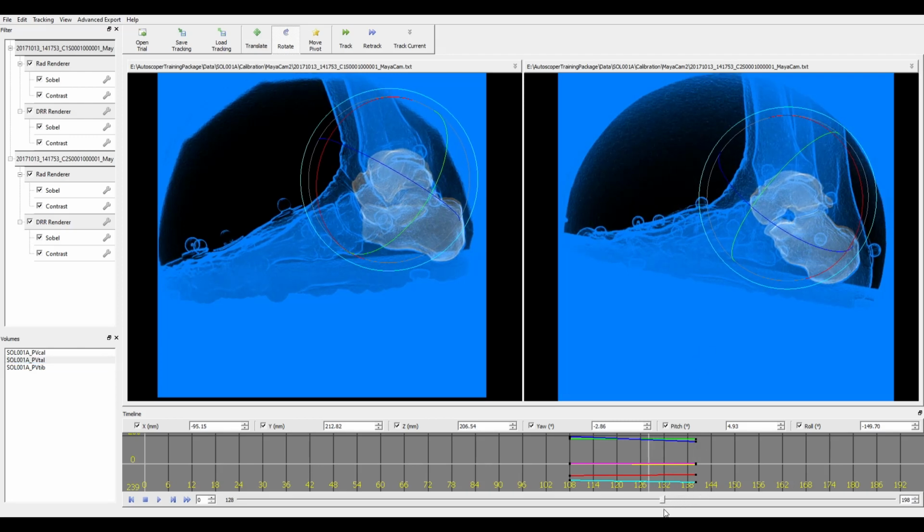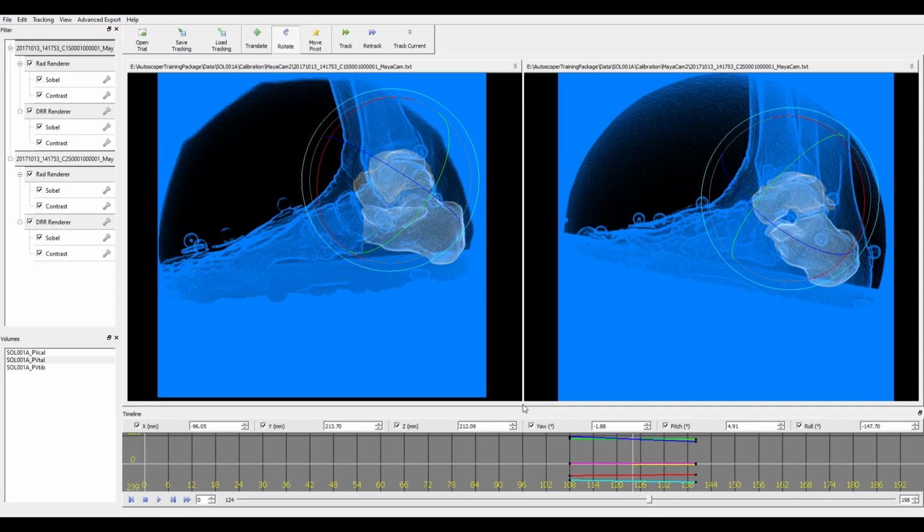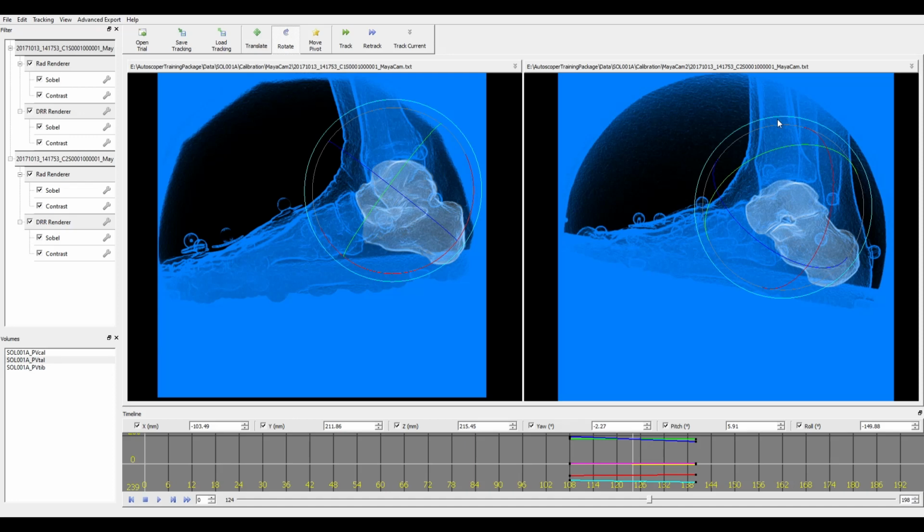And then we'll go to the other frame that we tracked. This is 124, and then I'll verify all three of those keyframes before I continue to make sure that they look reasonable in space, because everything's being interpolated off of them. So rotate that so we have 2 degrees of freedom. That's somewhat decent. Save that. Track it.